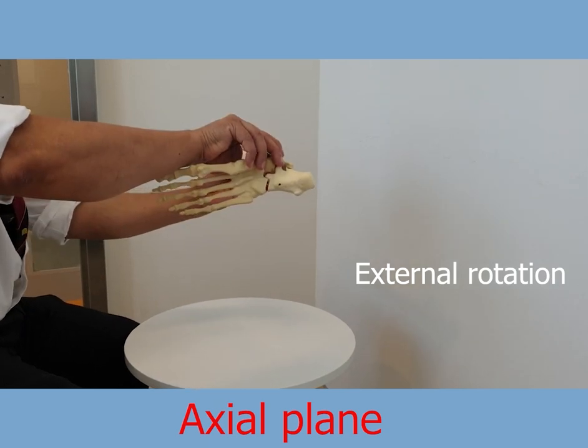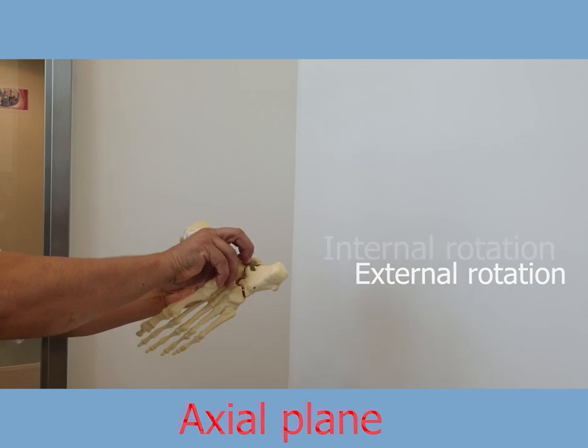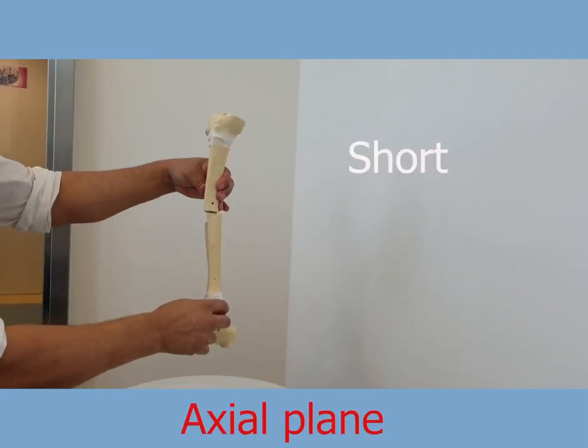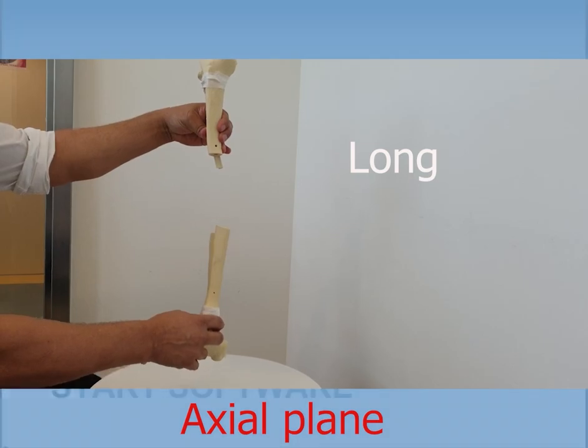And in the axial plane, there will be external rotation when the foot moves outward, or internal rotation when the foot moves inward. The translation in the axial plane is better seen from the AP or lateral view. This is short and this is long.